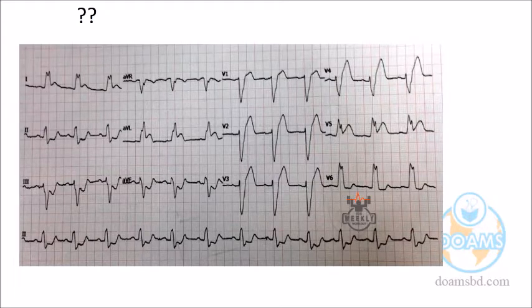Okay, Dr. Karishma? Yes, sir. So this is the technical message that LBBB is there, and the ECG is distorted for explaining anything additional. Very expert people can tell, but at our level, even general physicians will face trouble. So first identify left bundle branch block. That's enough.